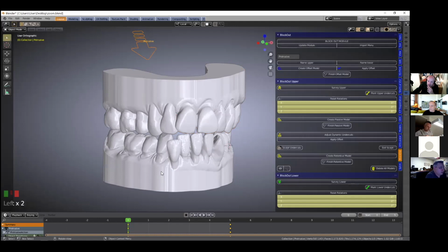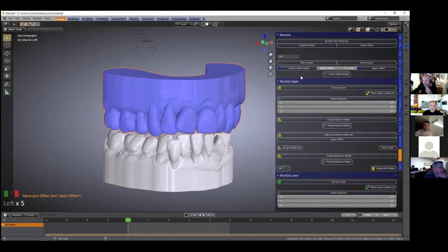All right, so let's just run through this. We've got this articulated. For a dual splint, we would need an upper and lower block type model. I won't explain what I'm doing. Can you just, to save time, do it on these models? Yes, I'll do it on these models.